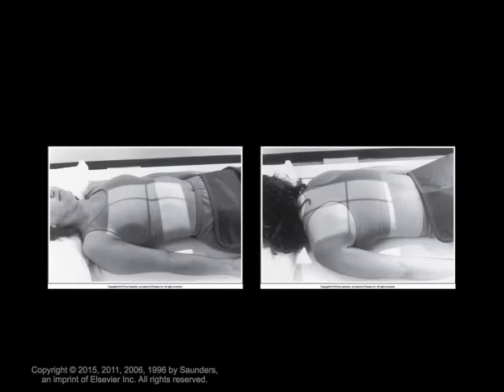And I include this image just to point out that anytime we're doing ribs, we're going to need to get some good history from our patients and very specifically say why we chose to do the ribs that we chose to do. So if the patient is hurting more posteriorly, we may do an AP projection, right, in order to capture those posterior ribs that are going to be closer to our image receptor down here.